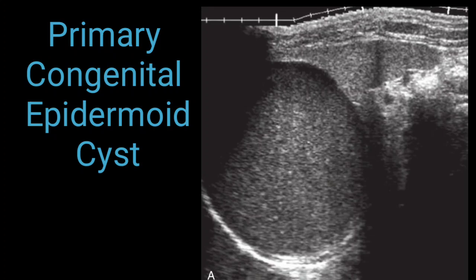Actually, an epidermoid cyst is characterized by the presence of an epithelial lining. When you look under the microscope, you will find the epithelial lining, as it arises from embryonic rest of primitive mesothelial cells within the spleen. So this is a typical epidermoid cyst, usually present with a well-defined thin wall, anechoic lesion, and the most important thing is they do not change over time.